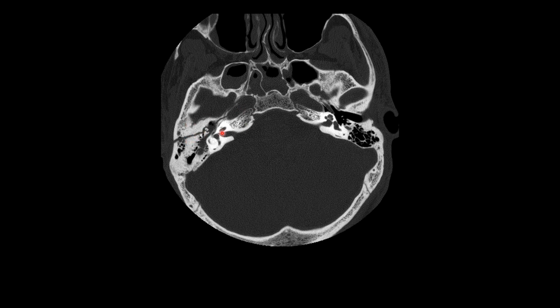Now such fractures generally happen from injury impact from the frontal or the occipital region. These longitudinal fractures commonly involve the ossicles, they involve the tympanic membrane, and they also increase the future risk of cholesteatoma development secondary to invasion of the squamous epithelial cells into the middle ear cavity through this fracture site.